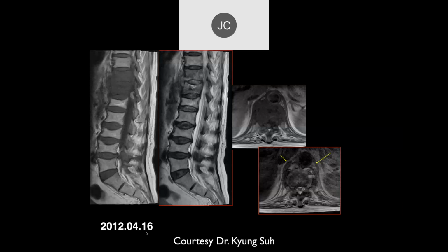What are you seeing here? Here, in the anterior soft tissues, it looks like there's some soft tissue that looks like it's enhancing, or it's bright. Much more involvement of T11 now than before. We can see that soft tissue disease with some enhancement there. And this was Candida albicans. Much slower disease than if it were a typical bacterial infection.